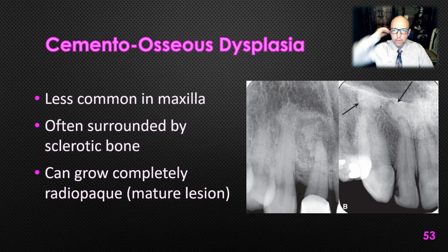This one I would classify as even more mature than the last one, where it's calcified almost all the way through, but you still see a little hint of radiolucency around the calcification. Look at the PDL space here, nice and intact and uniform, same with the canine there.